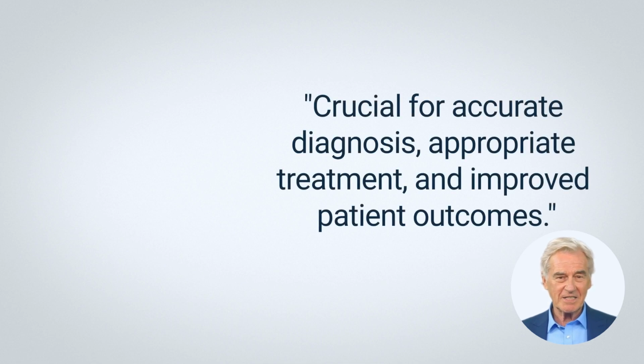Understanding the differences in ischemic patterns between STEMI and NSTEMI is crucial for accurate diagnosis, appropriate treatment, and improved patient outcomes. Recognizing the type of ischemia involved in each myocardial infarction can help guide clinical decisions and ensure the best possible care for each individual patient, ultimately leading to better recovery and long-term prognosis.